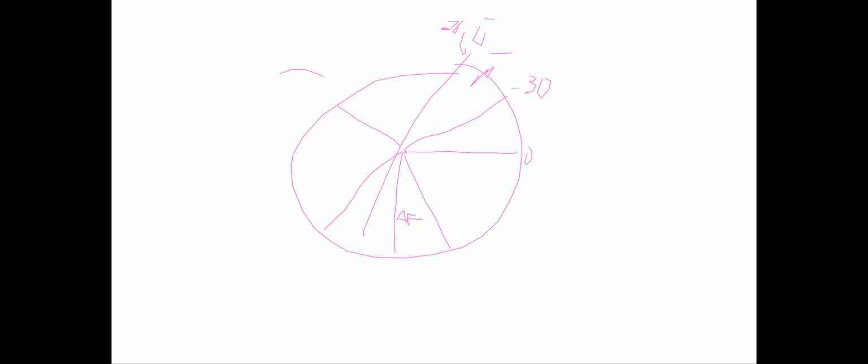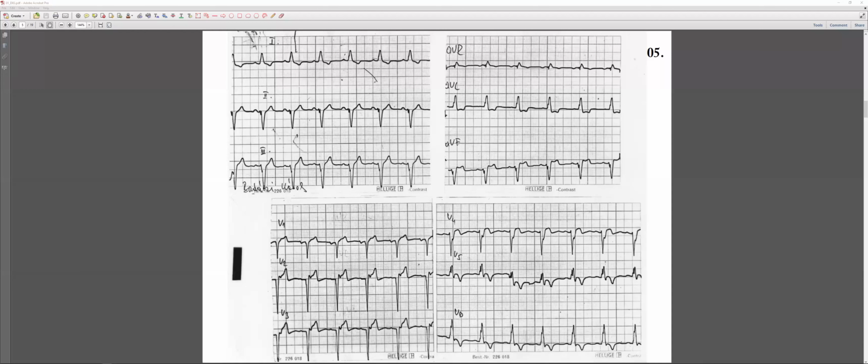Maybe we can leave it right here. That's great. And I can control. Let's go back. Now you can continue. Maybe I have to give you again the cursor. Where are you?